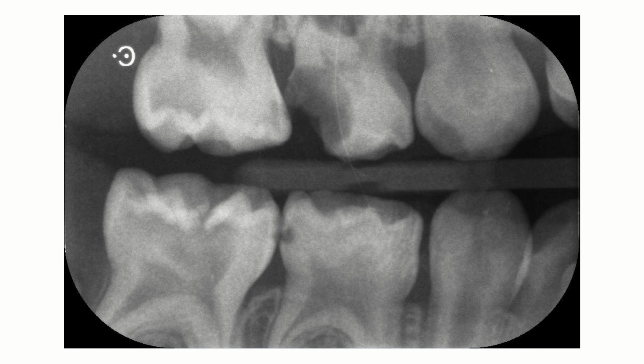In this video, I just want to go over this particular radiograph that came up in your exam, because there were some parts that everybody did quite well, but there were a couple of lesions on here that almost everybody missed, and I just want to highlight them to you. So basically I'm just going to talk through this entire radiograph in terms of the report, so you know the type of things that we were looking for, and you'll have a better idea of where you gained or perhaps failed to gain some marks.